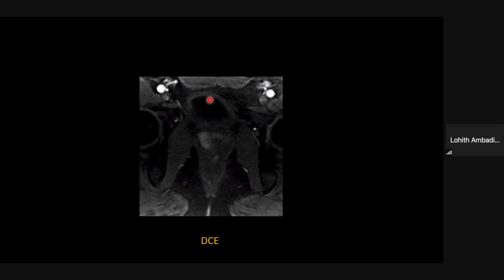Now, in this image, you can see that the urine in the bladder is dark. So this is a T1 weighted sequence, and this is a post-contrast sequence. You can see contrast in the femoral vessels. And you can see that only the right half of the prostate gland is enhancing. That is early enhancement in a dynamic study, and this is significant. This would be a positive dynamic study, and we would then look at the diffusion and T2 to figure out if it's a high-grade PI-RADS lesion. And even the fat is dark. That is because we are using a fat-saturated T1 sequence for post-contrast studies.